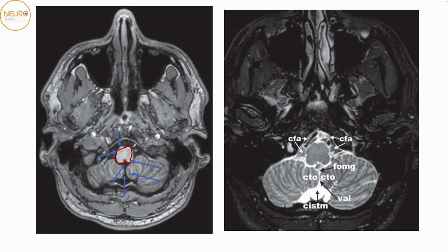At this level, we'll find out a few important structures that you can make out on imaging. So one of these here is the pyramid. This is one obvious prominence here. The next prominence is the olive. In front of the olive, the pre-olivary sulcus, and then you have the post-olivary sulcus. This will be the nucleus gracilis and the nucleus cuneatus located posteriorly.